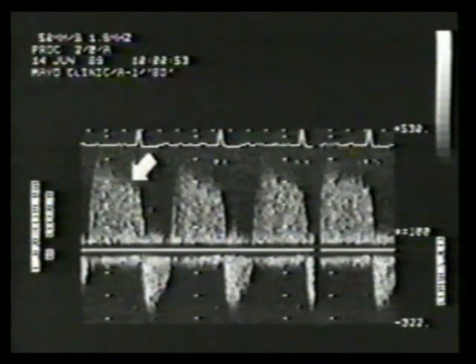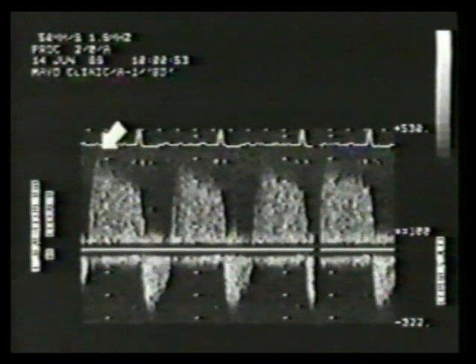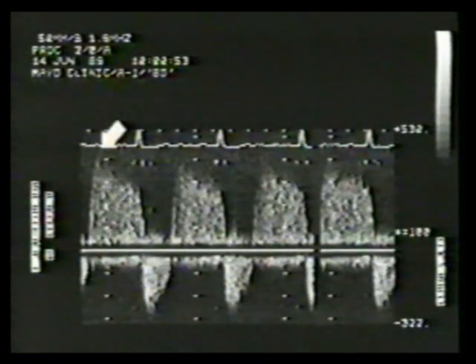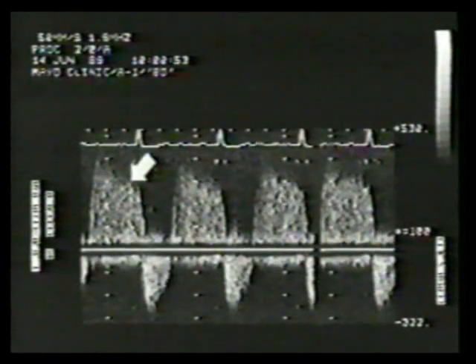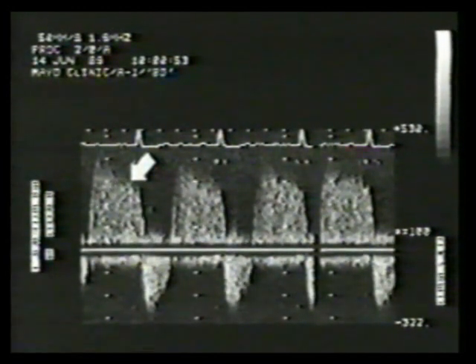For fully defined aortic regurgitation spectra, as we see here, the early diastolic velocity usually is 4 meters per second or higher. In addition, because of the higher level of aortic diastolic pressure, atrial systole does not alter the AR spectrum, except when the LV diastolic pressure is markedly elevated. There is no atrial notch on this AR spectrum.